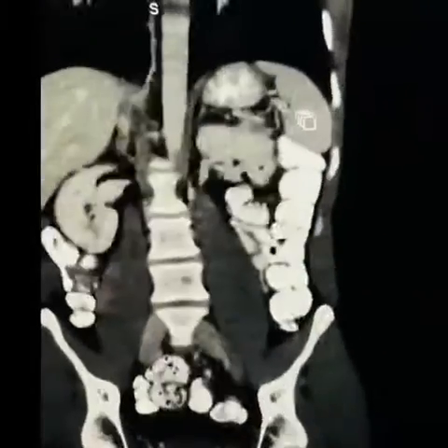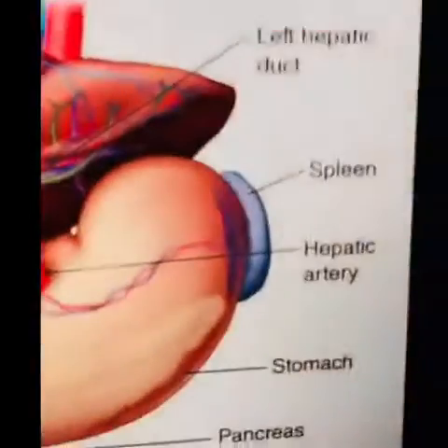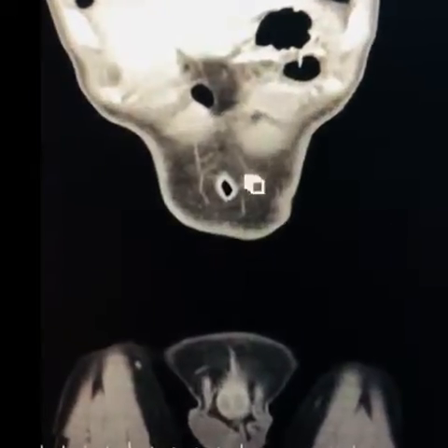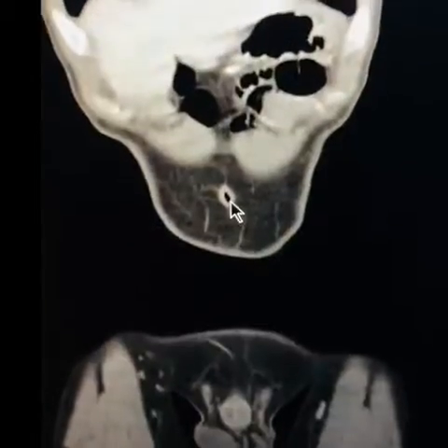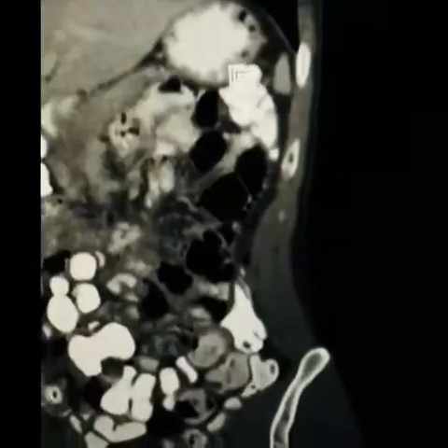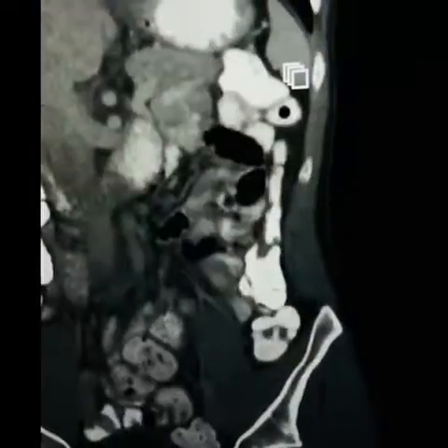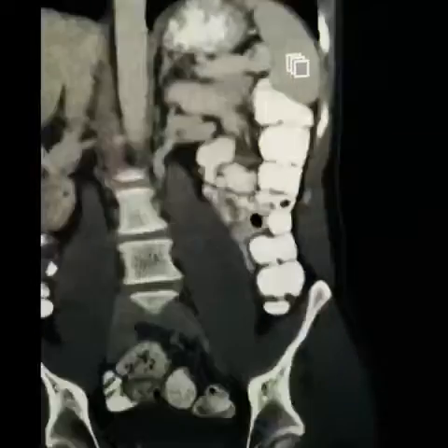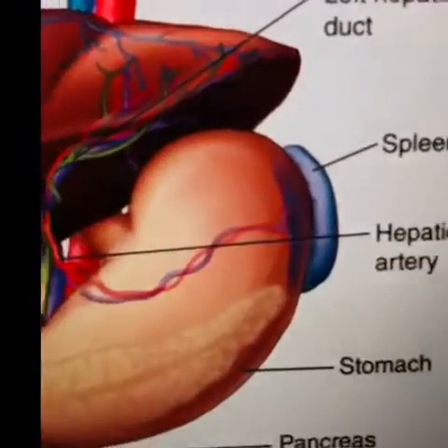The spleen is going to show up right here, just like in the picture. The spleen is hidden behind the stomach. So basically, watch, we're at the front of the body now. Here's the belly button, actually. There's the belly button. Little hole right there. So now we're scrolling towards the back of the body. We'll see the stomach, and watch, the spleen is behind the stomach. So the spleen comes in as we go closer to the spine. So that is how the picture shows.